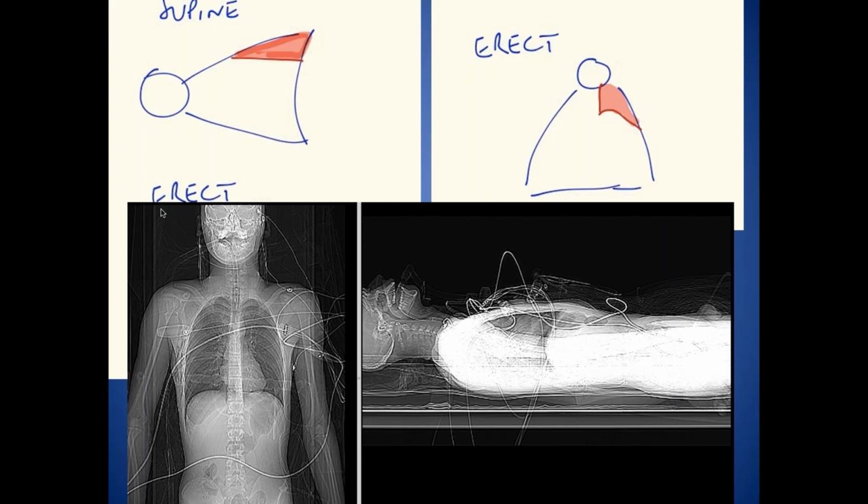Now, when the patient lies down flat, don't forget that any gas that collects in the pleural space is more likely to do so at the bases, because the bases are less dependent than anywhere else in the thorax. So you need to look very carefully at the CP angles and for the lucency over the liver for evidence of an anterior basal pneumothorax.